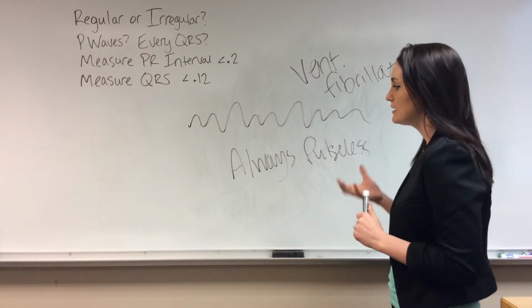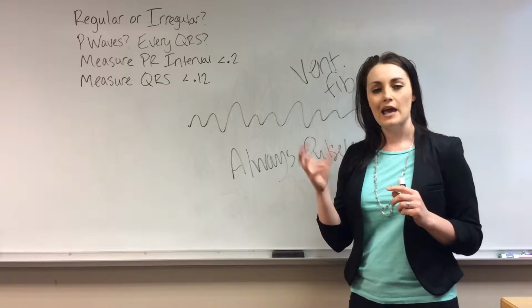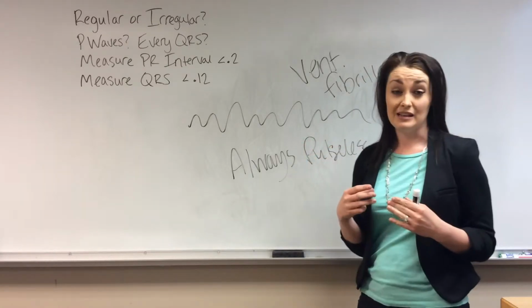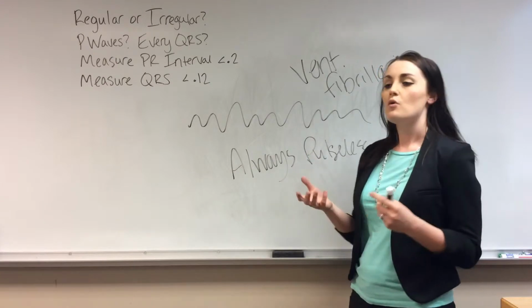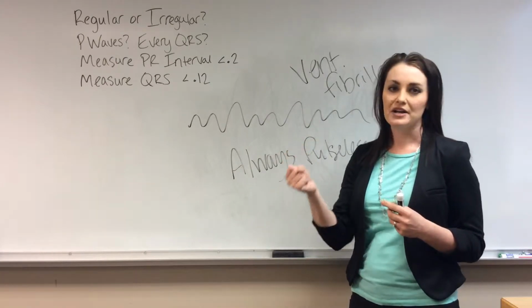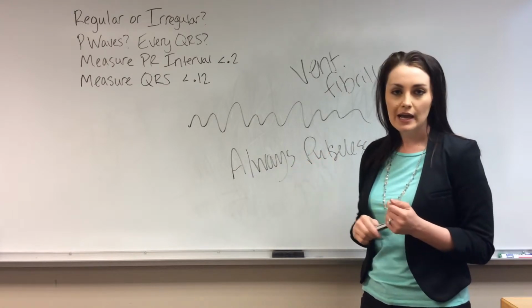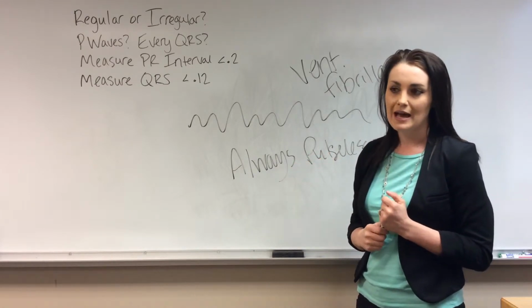And that's because this is totally chaotic electrical activity that's going on. There's no mechanical contraction that's happening with ventricular fibrillation. No cardiac output, there's no perfusion happening.